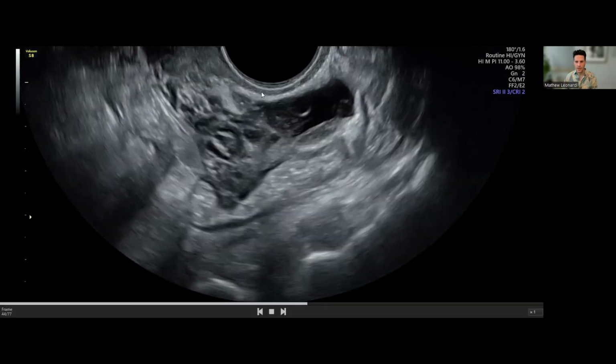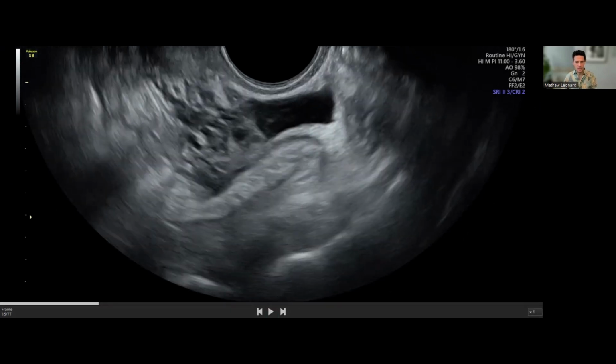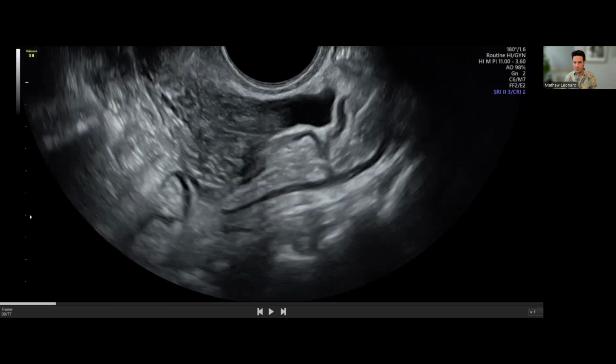All right, here we go. So we have a cine. And as I always teach with a cine, you can pause and scan through it nicely. So that's a good segment there.